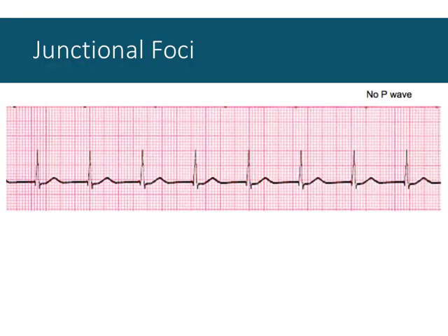The first obvious example where we have disconnection of atrial firing and ventricular firing is if something's wrong with the SA node or the atrial foci where there is no activation of the atria. In this case, we see no P waves. The characteristic lead 2 trace, which has P waves, QRS complexes, and then T waves at the end, shows no P waves, indicating absolutely no atrial firing.